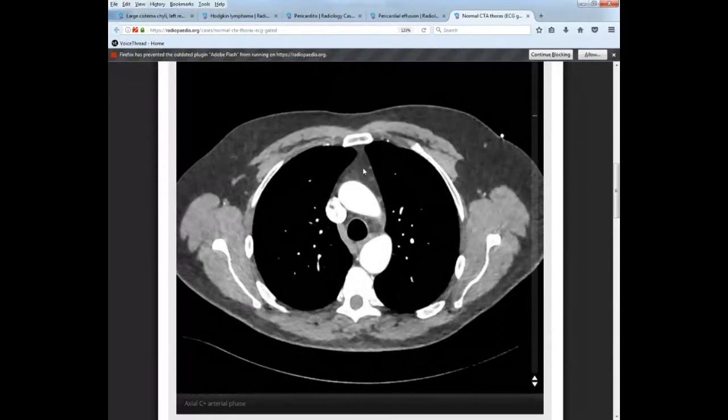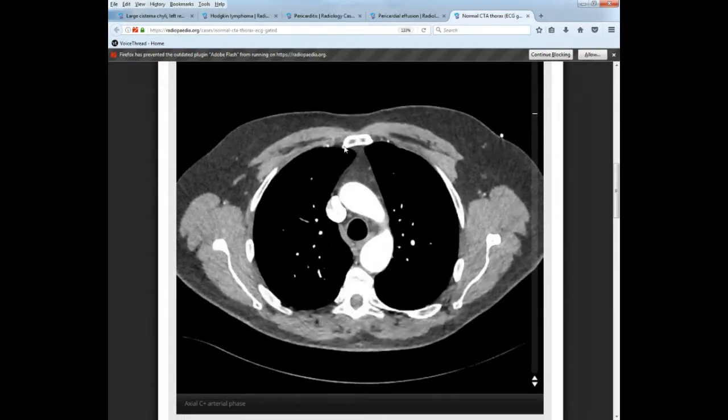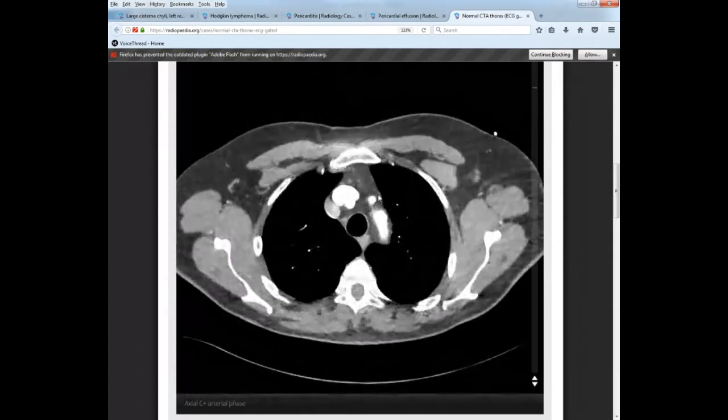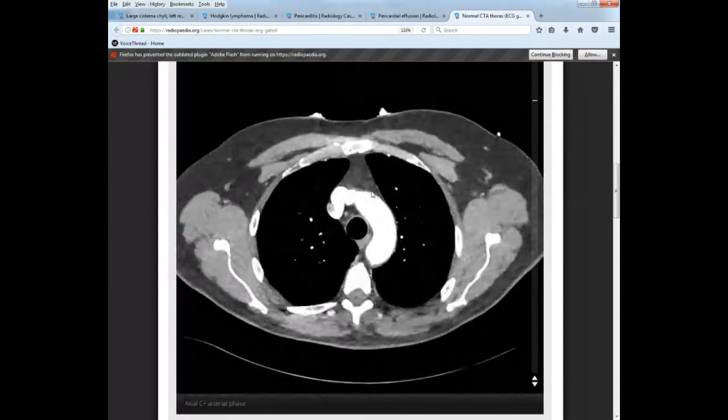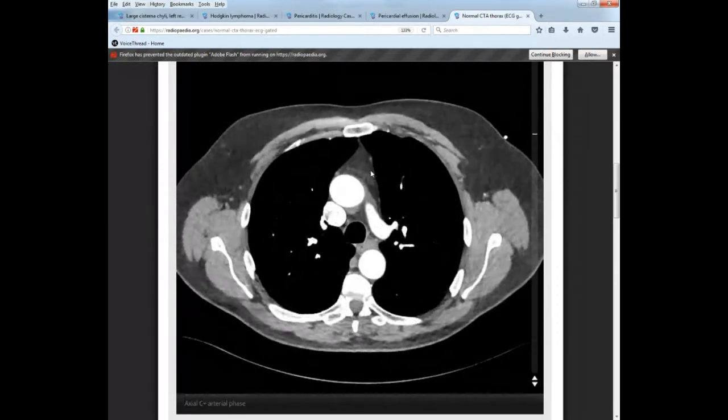converted to fat. I couldn't find a CT of a pediatric patient to show you the difference, but as you guys scan patients, especially pediatric patients, I want you to be mindful and look in this area, posterior to the manubrium, anterior to the ascending aorta and the pulmonary trunk, kind of in this area. And you're going to see this triangular area. You'll actually see the bilobed thymus gland.